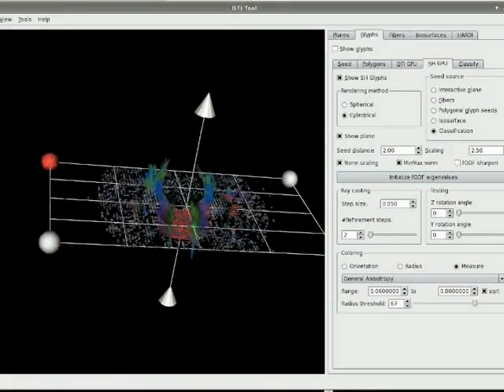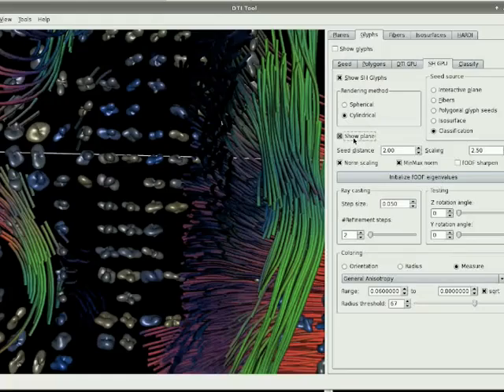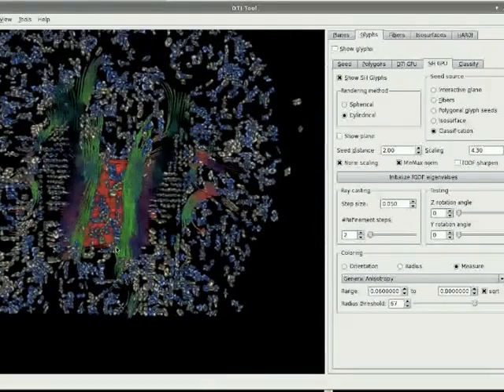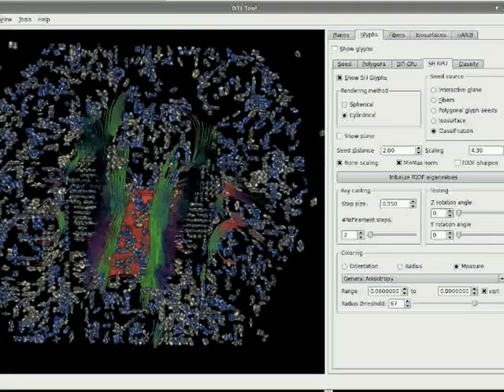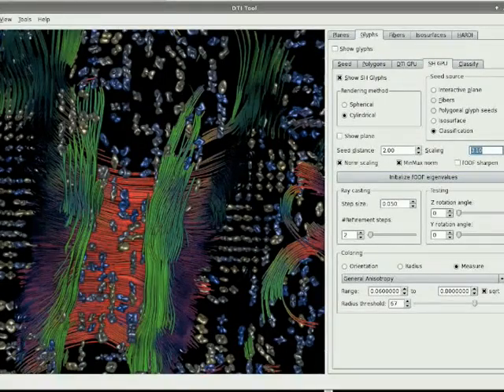We can go through a full brain slice and interactively move through the data. Specifically in this case, the data is represented by 1/3 of fiber tracks and 2/3 of HARDI data because of the classification. And now we can look at individual parts of the data and furthermore explore.